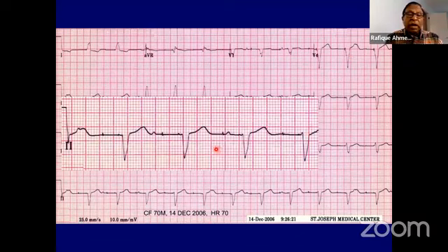Okay, so what Aziz is mentioning is the blanking period. Now, the blanking period is designed to make the pacemaker blind for a very brief period of time, and it is usually between 40 to 80 milliseconds, not more than that. So if that was true, it would have been over here. If it didn't see any P wave over here, it can be a blanking period or within the atrial refractory period. But this is way outside. This is about 400 milliseconds outside. So this is not in the blanking period time.